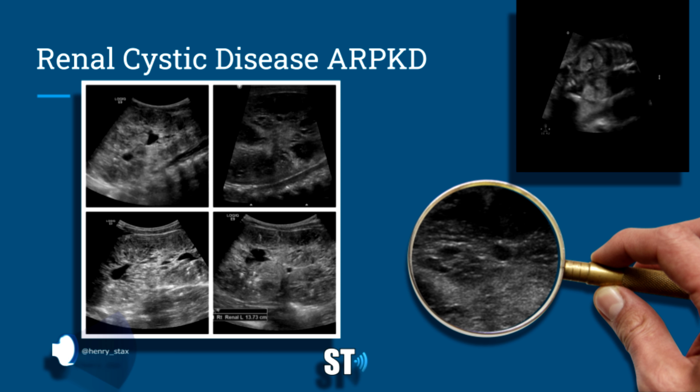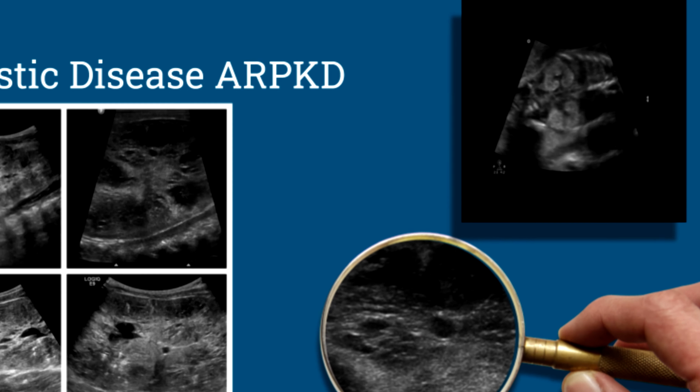All right, here we have a case. On the right upper corner, you can see the fetal image, two enlarged hyperechoic kidneys. The kidneys can get even larger than that. They can get pretty large.